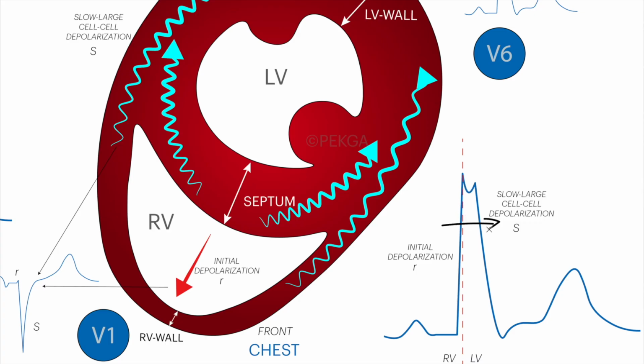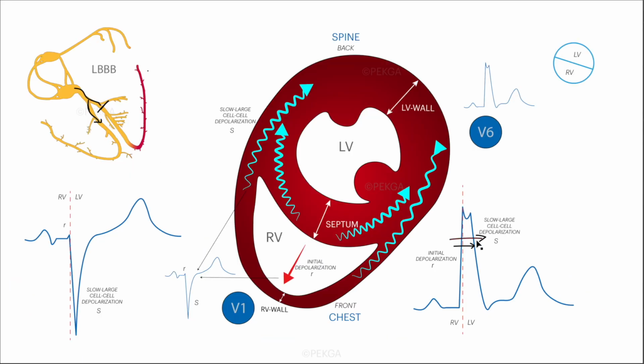So it's taking longer for the QRS to complete this depolarization. Therefore, your ECG is going to take a longer time for this wave to happen, right? The wave gets fat, it gets wide on your ECG. Okay, I think that was probably clear as mud.